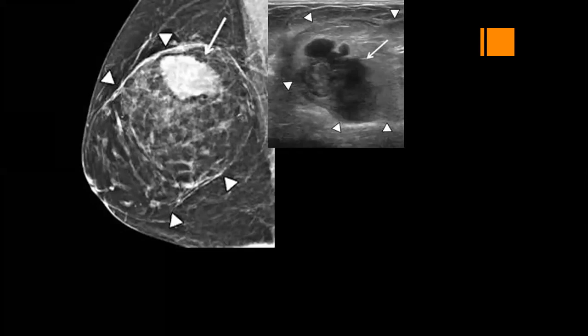If you remove the fat, it will be fibroadenoma. So hamartoma, fibroadenoma and phyllodes are stromal, containing stroma as well as gland.